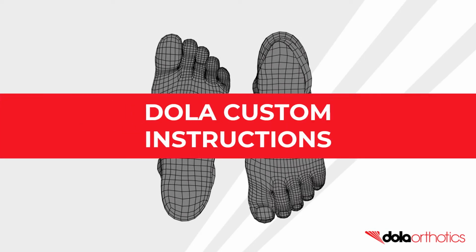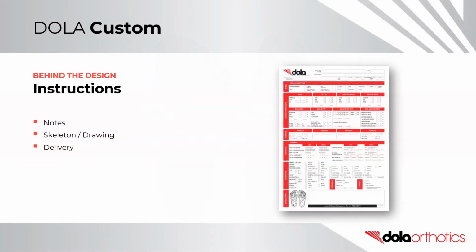DOLA Custom Prescription Education, the Instructions section. Behind the design, Instructions. This section of the presentation will explore how to use the Instructions section for additional notes, drawings, and to select your delivery options.